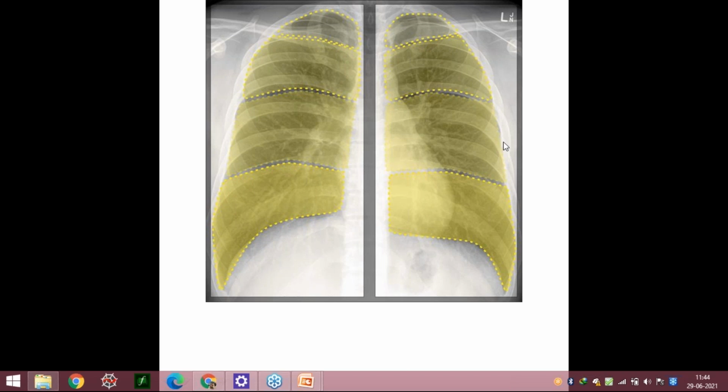Okay. So this is what you are seeing in breathing. You're seeing the lung parenchyma. You are seeing the angles. You are seeing the lung vasculature and the angles. So these are the things that you're supposed to see in a breathing aspect.